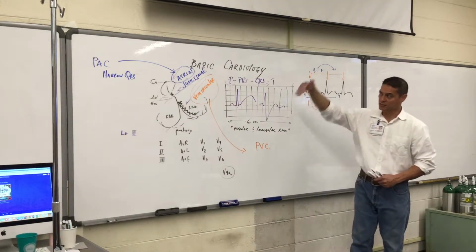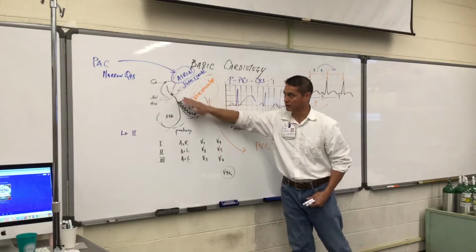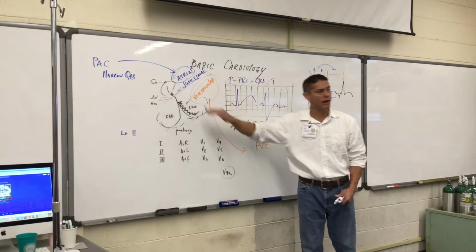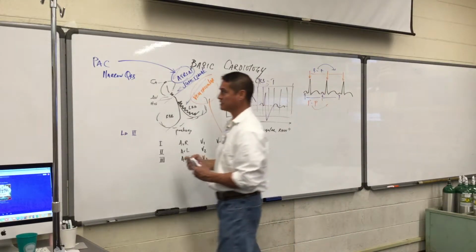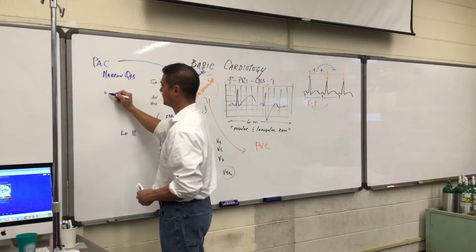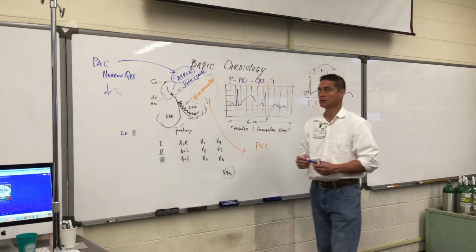Right? And it's because it's coming from above the ventricles, and the energy that it travels down, this conduction pathway or wires within the heart, allow it to stay in a narrow complex. So what we'll end up seeing is you'll still see somewhat of a P wave, a narrow QRS complex, and a T wave, but it's just a narrow complex.